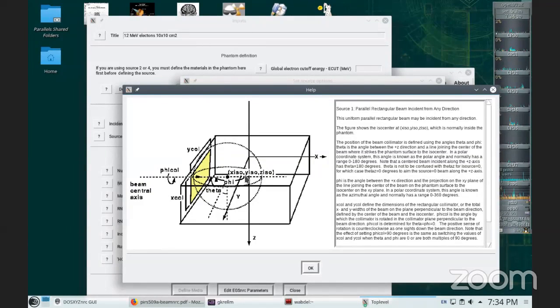That's why we need to flip it, to make the source have a 180, so that particles are emitted in this lower direction. So I don't think what's been suggested will work, but I could be mistaken. You just enter it and see if you get the dose or not, and whether it makes sense or not.